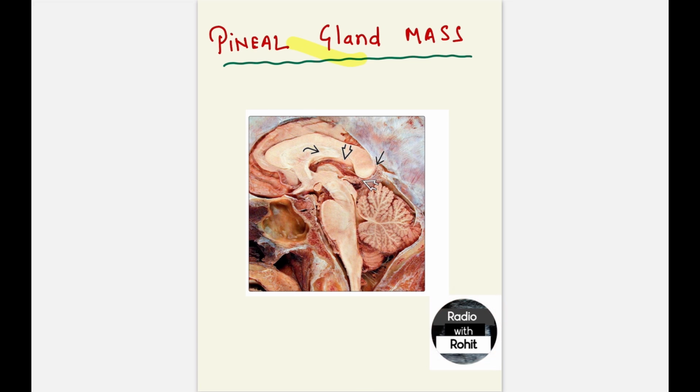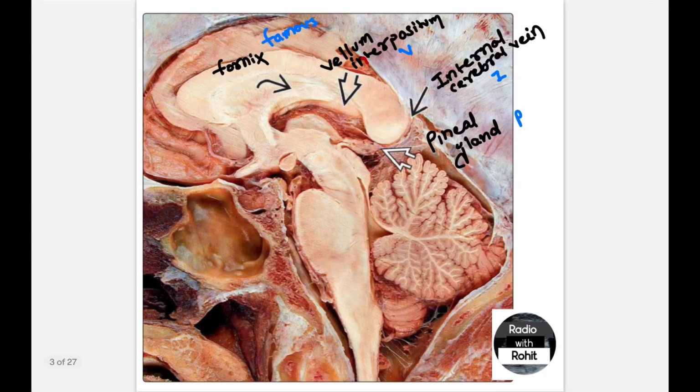Today we are going to discuss the pineal gland mass. In sequence, first we will discuss the anatomical location, then the differential of the pineal gland mass, then how to report on MRI and CT scan. So let's start our discussion.